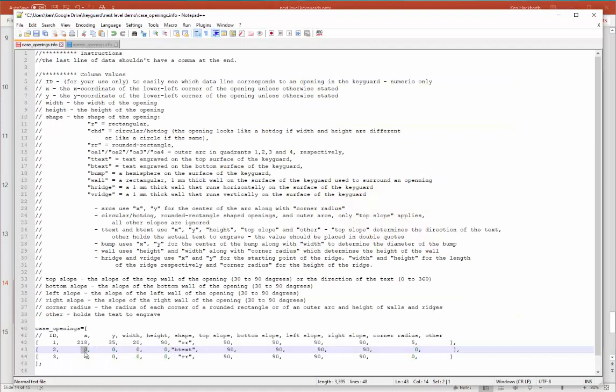So a small amount in the X direction, and we're in millimeters, we're not in pixels anymore. So let's try 5 in the X direction. It helps to know the height of my case opening, but let's just assume, say, 40 in the Y direction because we know it's larger than the X, and we'll set our height to, remember, millimeters now, not pixels, so a smaller number goes a long way.